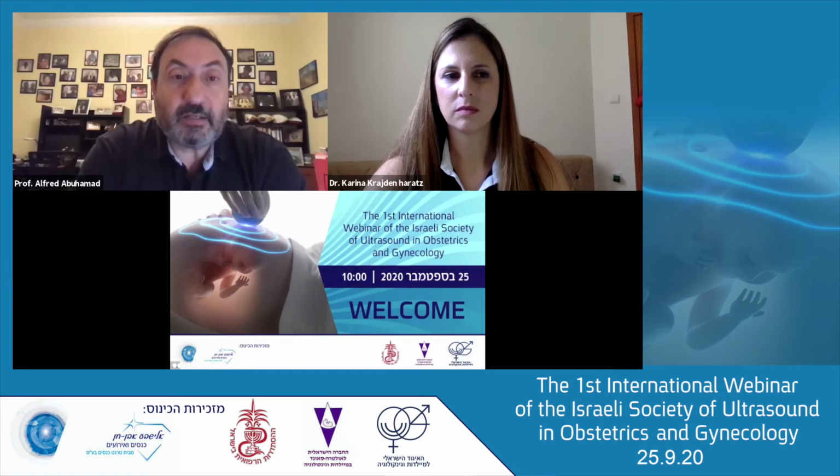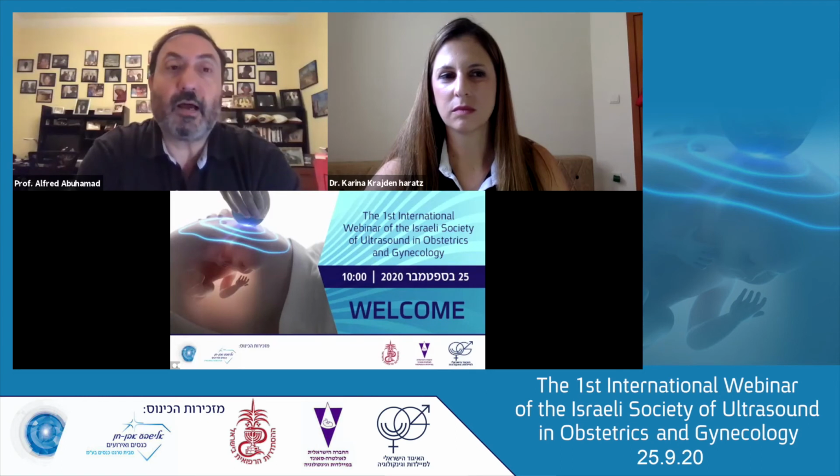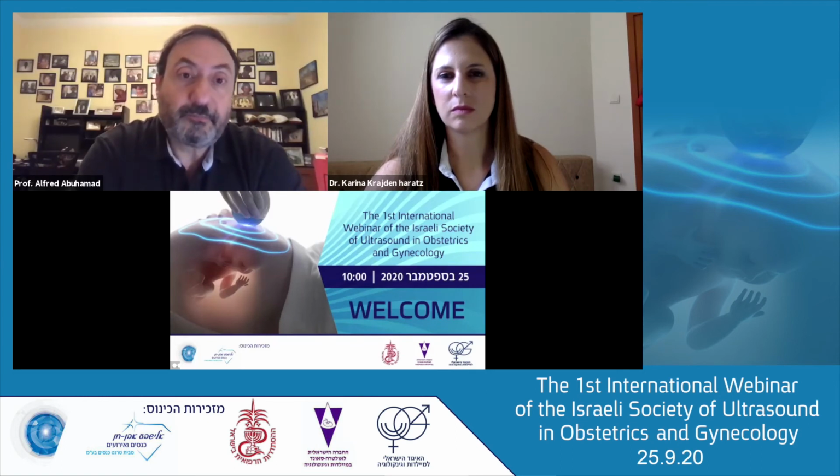And the 3-vessel trachea view is critical to the evaluation of the outflow tracts. The LVOT plane is difficult to get in the first trimester. It's a very thin plane, and I don't think it is that helpful because it's really hard at 12 or 13 weeks to look at aortic override and so forth. But the 3-vessel trachea view is fairly easy to get. And it shows the relationship of the great vessels. So at least you can get some good reassurances for that.